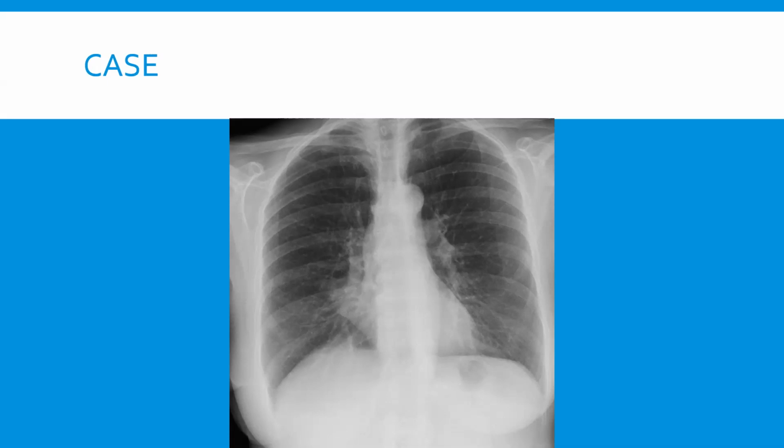So this is an AP X-ray of an unknown patient. Starting with adequacy, it does appear to be slightly rotated looking at the clavicles. Penetration is good, and you can see all of the bones and the start of the shoulder joint. Moving on to A, airway: the trachea doesn't look deviated and there's no obstruction. Breathing: lung fields appear clear to me, and you can see both costophrenic angles and the cardiophrenic angle.